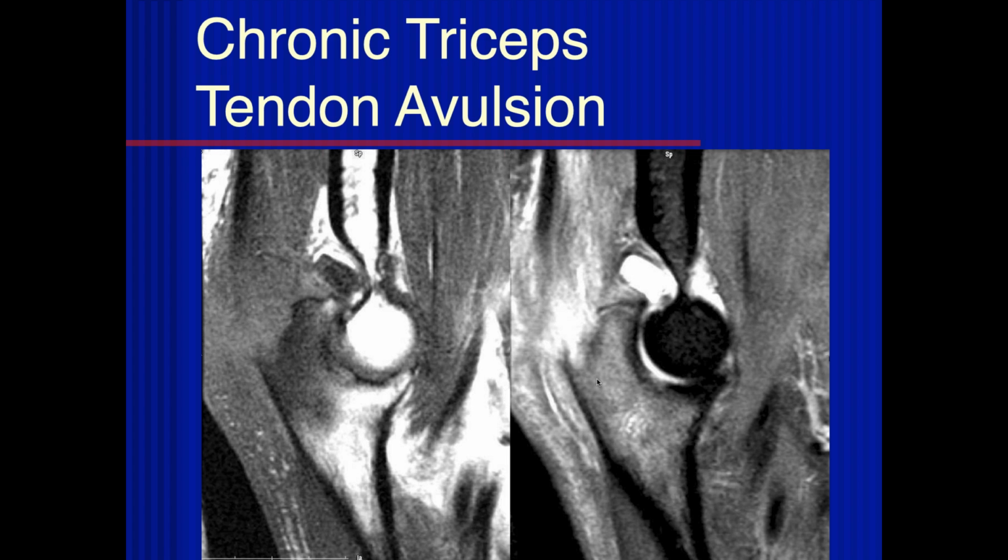What's that structure in the posterior aspect? Oh, wait a minute. That's fluid, isn't it? Yeah. Sorry. But that does look like there's a piece of olecranon missing. Yeah, that's right. There's erosion here, but we didn't find a piece of bone. This has been strictly chronic degeneration. Yeah, he's had symptoms for years. That's not a young person, probably.